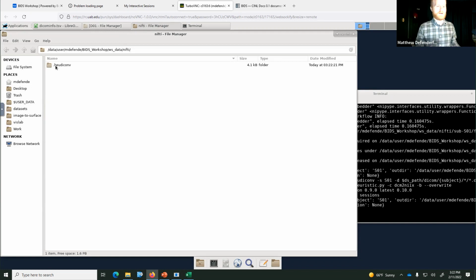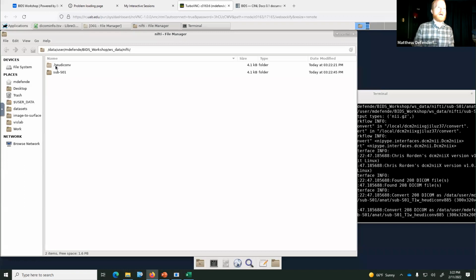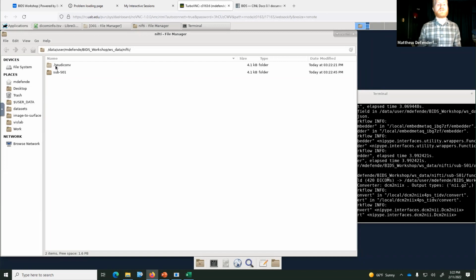You can't edit it. Unfortunately, this is not especially useful for things like fMRIPrep, where fMRIPrep is reading all of these scans, and it requires for some of its processing write permissions on these DICOMs, or I'm sorry, on these nifty files.